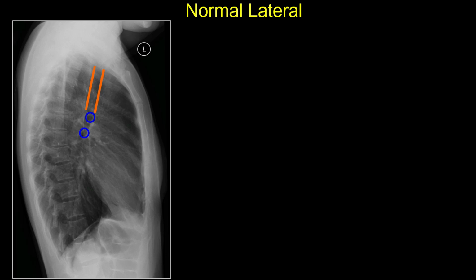From what we understand, the bronchus that appears as a circle when you look from the patient's side is that of either the right upper or the left upper lobe bronchi. And the bronchus that arises superiorly is the right upper lobe bronchus, while the one that arises a few slices below is the left upper lobe bronchus. So looking here, the circle above is the right upper lobe bronchus.